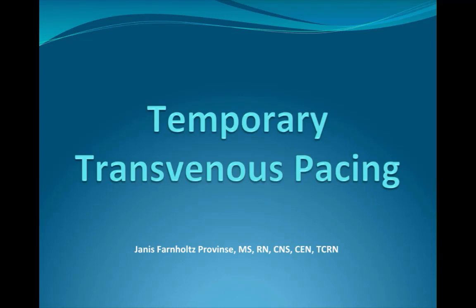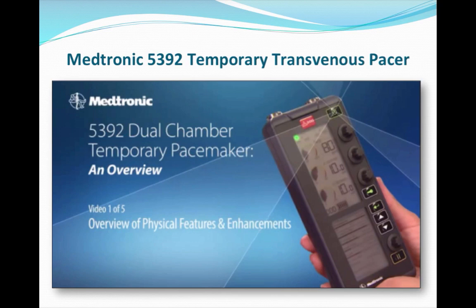Hi, it's Janice. We're going to talk about temporary transvenous pacing. Our new dual chamber temporary pacemaker allows us to do some new things and has different modes, and we'll discuss those in a little bit.